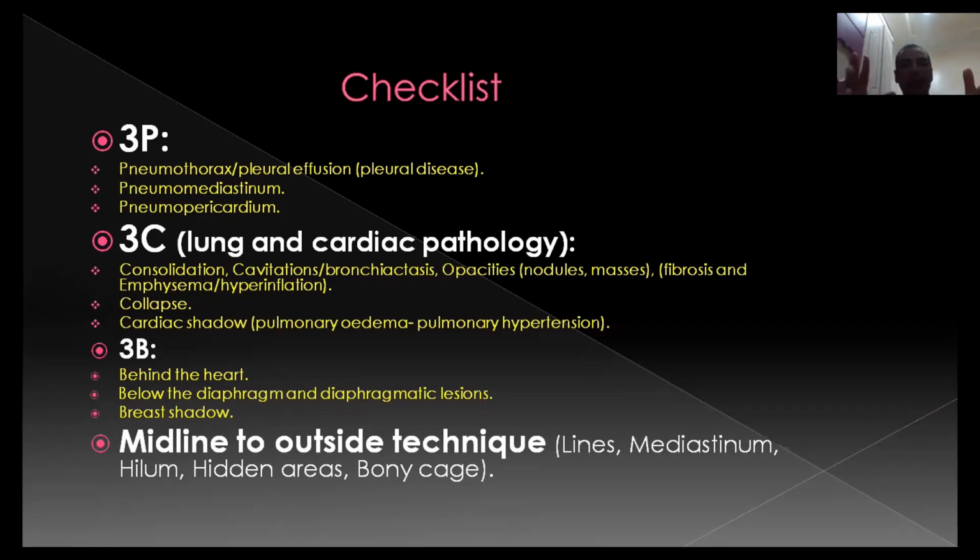Chest X-ray is mainly indicated if the patient has symptoms, to be a baseline if you need to follow up the patient. This is the most important point of chest X-ray in this patient. But it's not performed to diagnose the case as COVID or not, because in most cases, especially in the early phases of the disease, it will be negative.